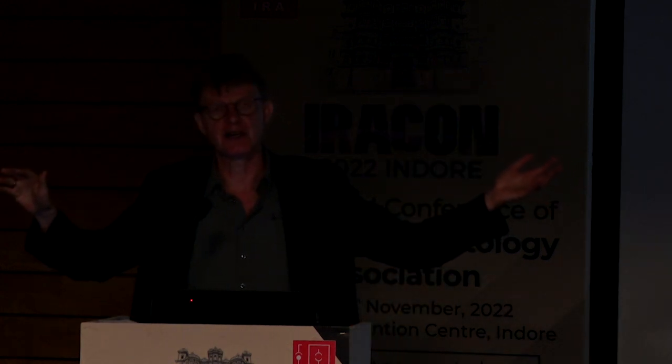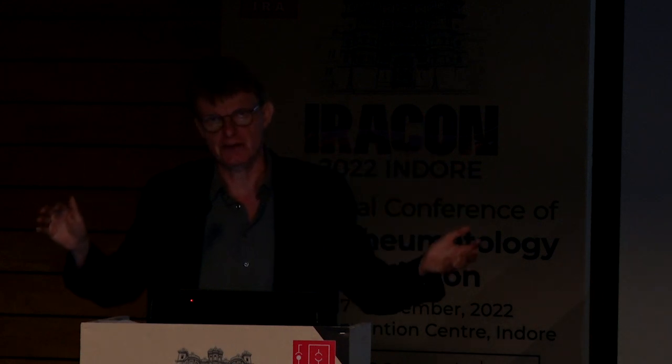And then of course, when we look at things in real life, we also look at whether there's something else that takes up space or other things. But here in the beginning, just look for those things.